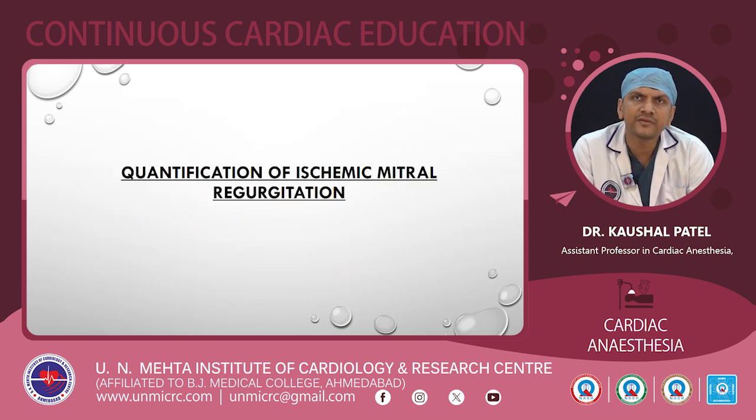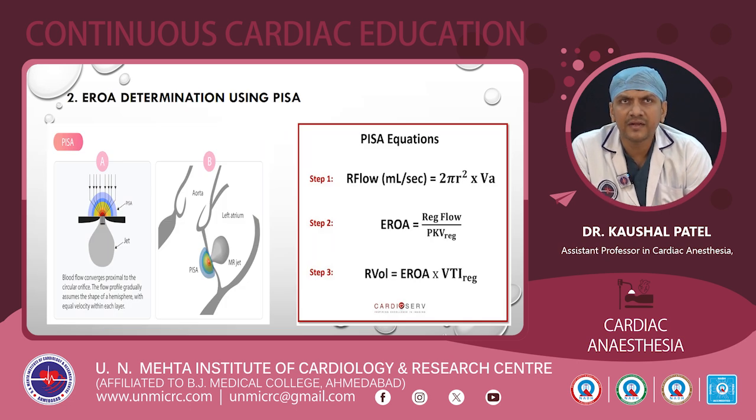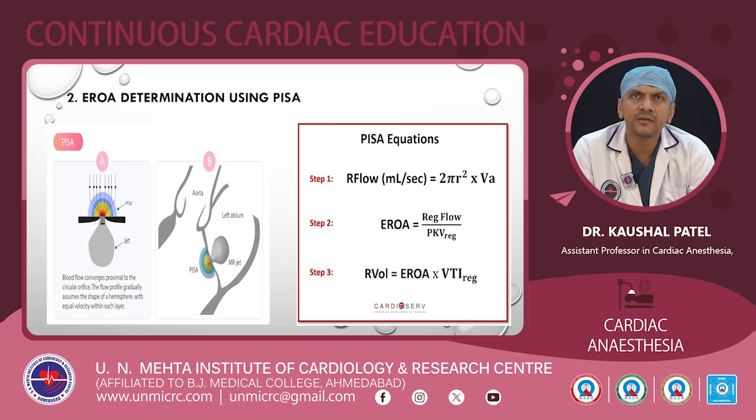Okay. Now coming to the quantification of the ischemic mitral regurgitation, first is the vena contracta. Vena contracta is the width of the regurgitant jet that escapes the orifice. The vena contracta is basically elongated along the coaptation plane. So we are going to see the vena contracta in basically two views, that is the mid-esophageal 4-chamber view and the mid-esophageal 2-chamber view, at the level of the coaptation point just below the annulus. By vena contracta we can roughly tell whether the MR is mild, moderate or severe.